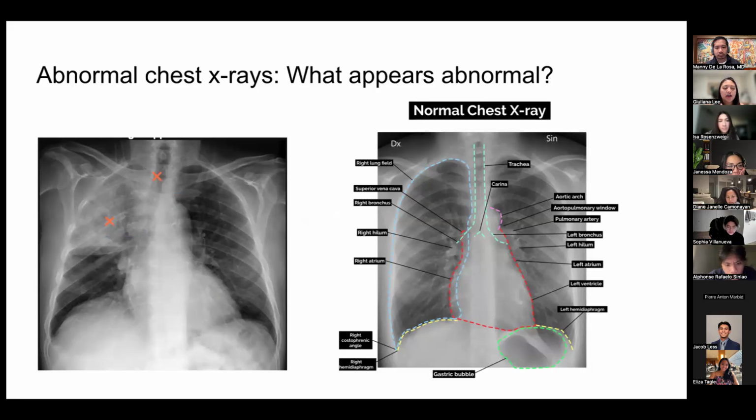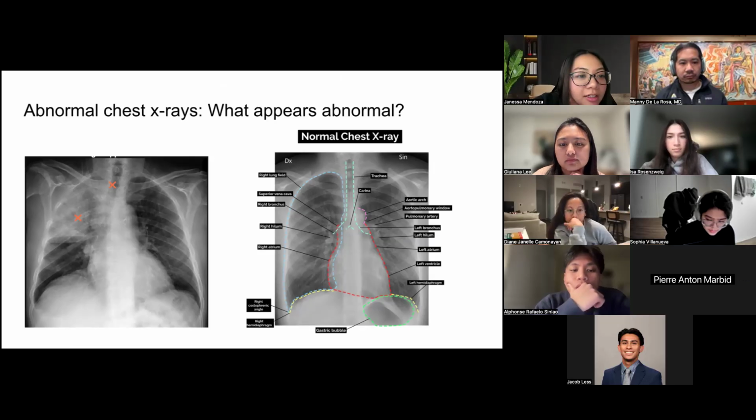Okay. I agree. There's not too much going on, so I'm glad that people are calling out the big obvious differences. Anyone want to call out why they put an X down somewhere? How they would describe this chest X-ray if your senior resident was like, "What's happening? Read this." For airway, the trachea looks deviated to the right. Very, very good.